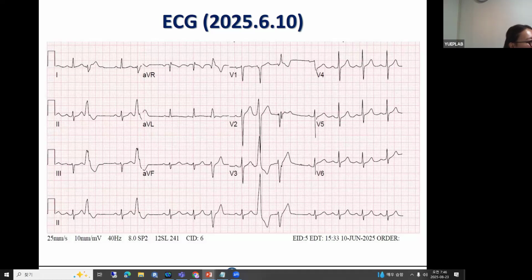Another thing I would like to point out from the previous ECG and this ECG: why is the sinus PP interval short? His heart rate is around 90, or over 80. The baseline heart rate is pretty fast. But then the patient has a significant rate variation. This PP interval here looks slightly faster than this here, right? But the patient had a bigeminal PVC, and then you got a longer coupling pause and then a slowdown.